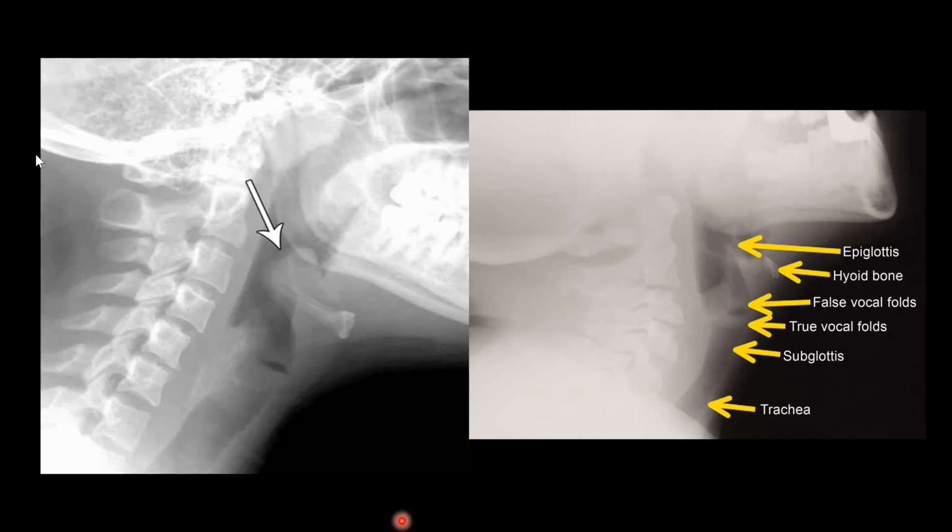Okay. So we will move. I will always say next, and you will understand that. Next slide. So if you look at the lateral view again, you can see the air passing through the nasopharynx and then oropharynx and then going into the trachea.